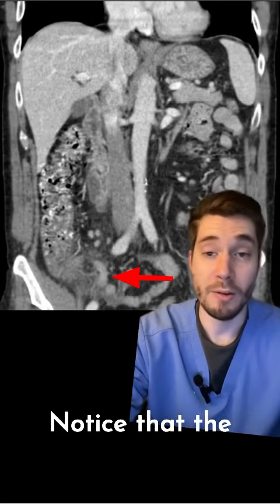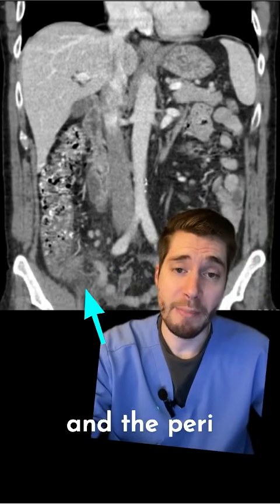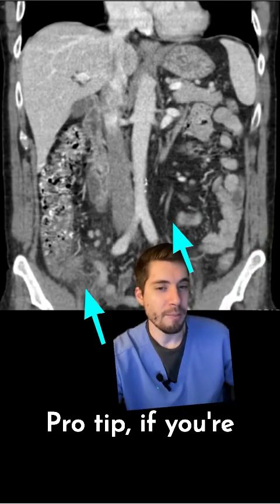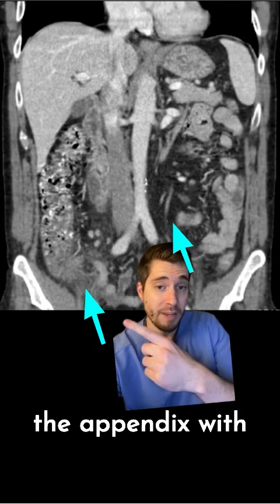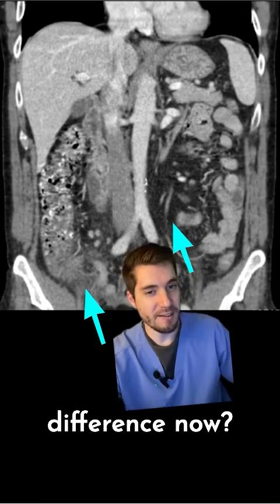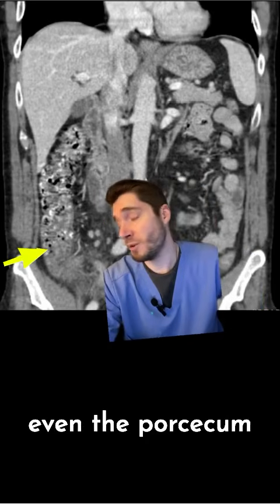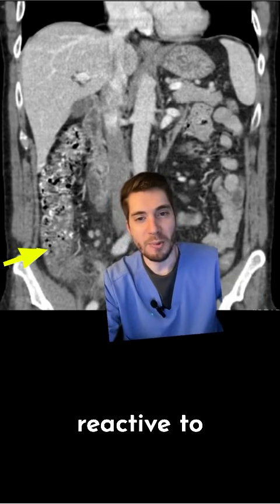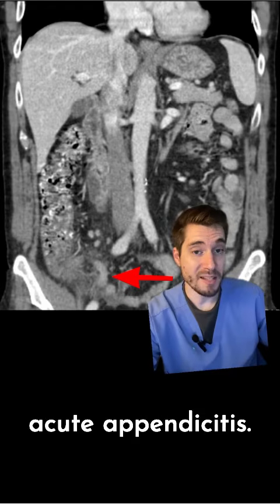Back to our patient. Notice that the appendix is slightly more dilated, and it's surrounded by all this edema in the periappendiceal fat. Pro tip, if you're having trouble identifying edema around the appendix, compare the fat around the appendix with other normal fat in other parts of the abdomen. See the difference now? We also have some reactive lymph nodes in the right lower quadrant. And even the cecum looks swollen, probably reactive to the adjacent appendicitis. All these findings are concerning for acute appendicitis.